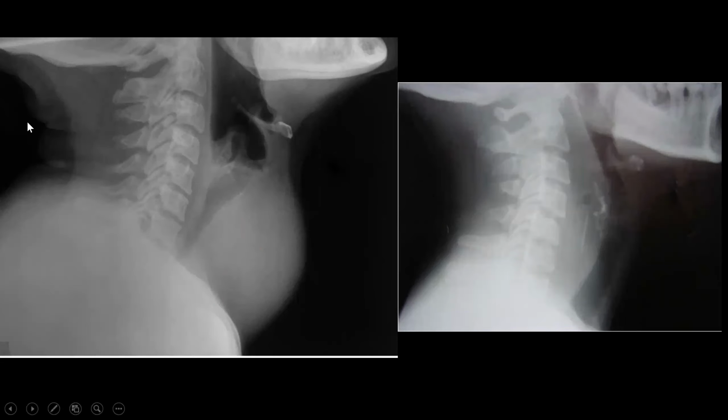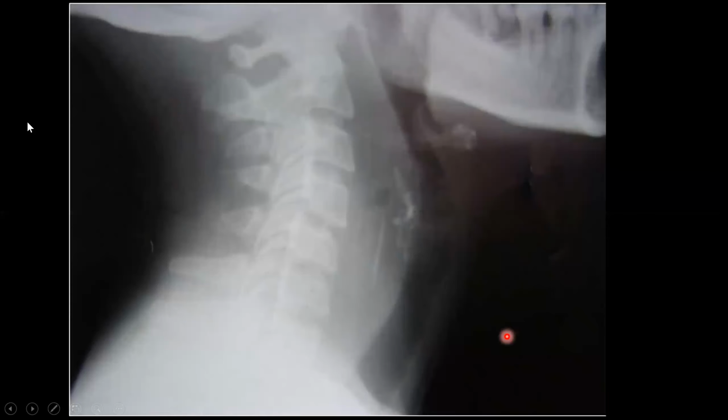Now, if you look at, which was actually the same on our right side in the previous one, but I didn't show.